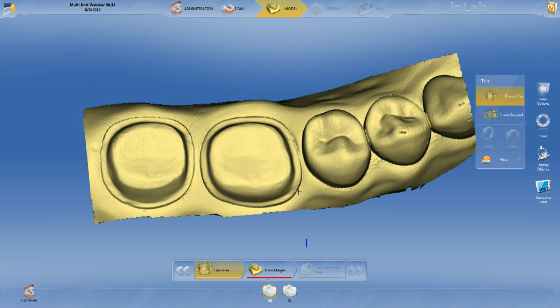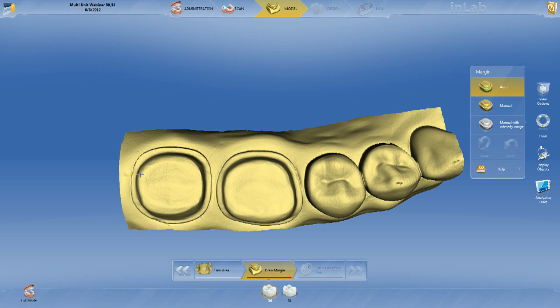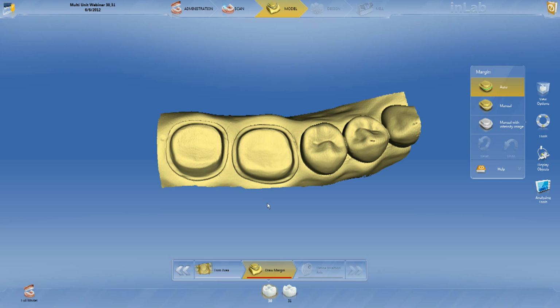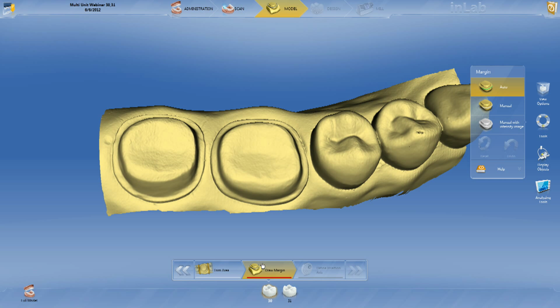Now, I do a lot of Sirona Connect cases, so I don't really cut my dies too much. So I just go right for the nitty gritty. You have to make sure that the tooth you're working on, number 30 and 31, you click right. Trust me, I've done it many a time where I'm doing number 30, and all of a sudden I go, oh, I'm going to click around this tooth right here and pick my margins around here. Next thing I know, everything's backwards, and I'm complaining that the software is no good. But we understand that user error happens quite frequently.